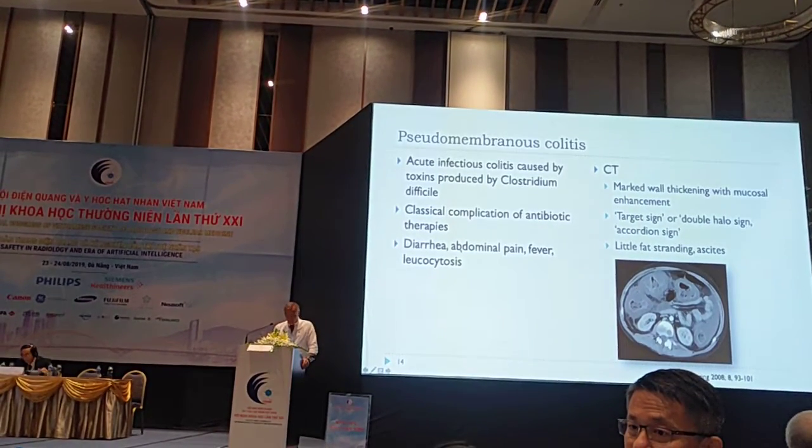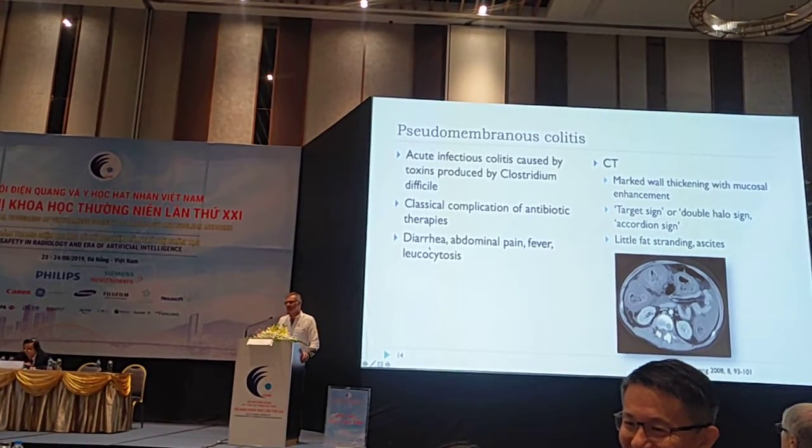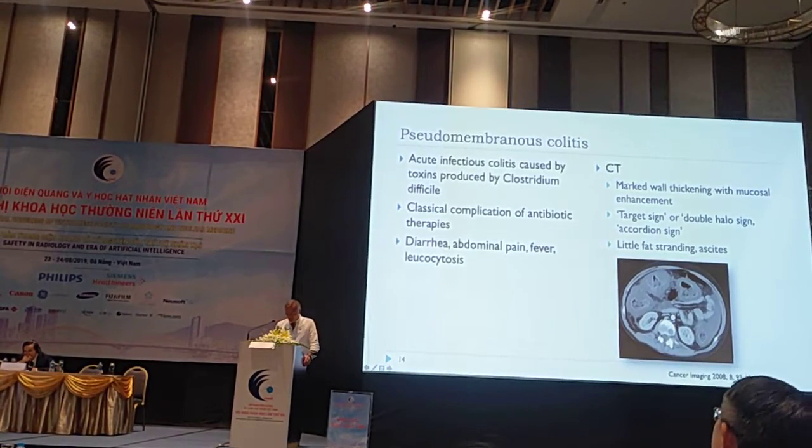And this is a very classical complication of antibiotic therapies. The major symptoms are diarrhea, abdominal pain, fever, leukocytosis. And in this case, you have to know how to make the diagnosis. What do we find at CT?